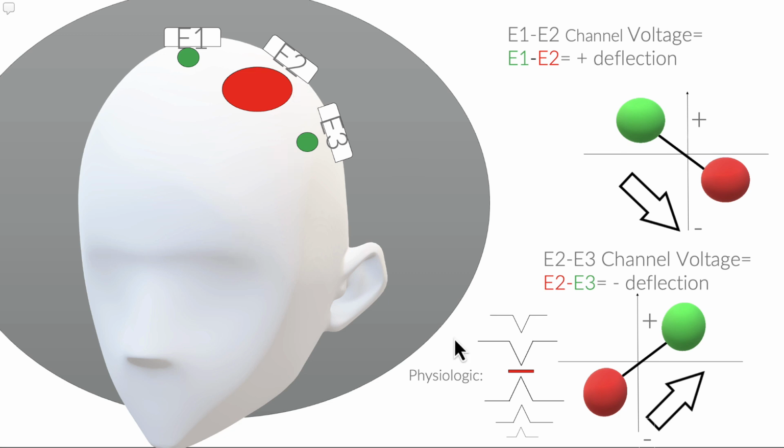And that is a point I want to make, is that when we talk about this, we are often talking about an AP bipolar montage, which, if you review back to the original lectures, is the most commonly used standard reviewing montage. When you start to use alternate montages, there should still be very much a physiologic field, but it may not be quite as straightforward as what we've discussed so far here.